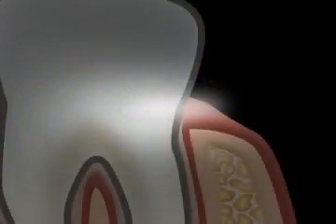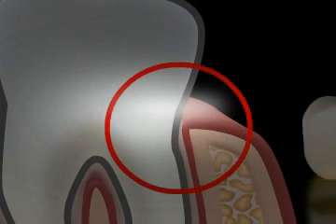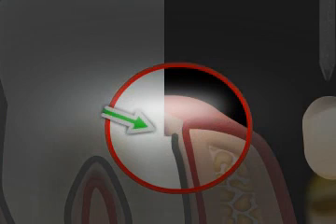Another frequent mistake is the lack of preparation margins. When the dentist cuts the tooth for a crown, a preparation margin results. A preparation margin refers to the point where the uncut tooth transitions into the cut tooth. It's imperative that this preparation margin is apparent in the impression. Otherwise, the dental technician does not know up to what point he should prepare the crown margins.